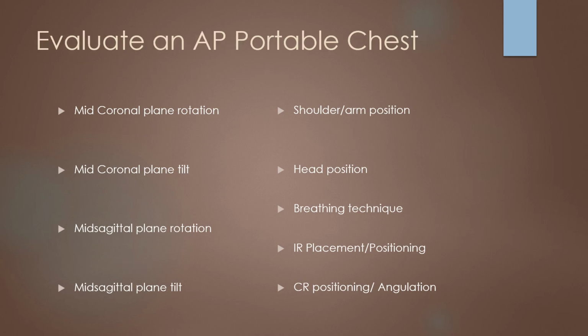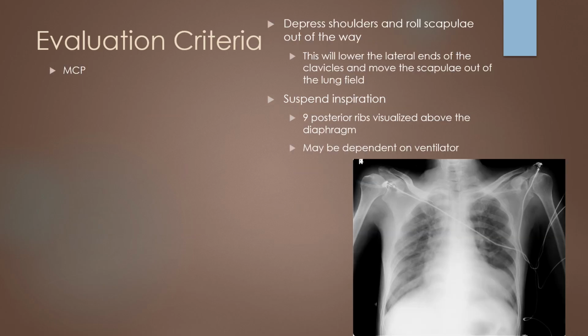When you evaluate the AP portable chest x-ray, I'm going to let you guys run through this yourself. I'll give you about 1 minute to review this slide, fill in your answers, and then we're going to go through and look at how you did when we see what the actual criteria is. So feel free to pause the slideshow if you feel like I went too quickly through that, but I don't want to make you wait on me.